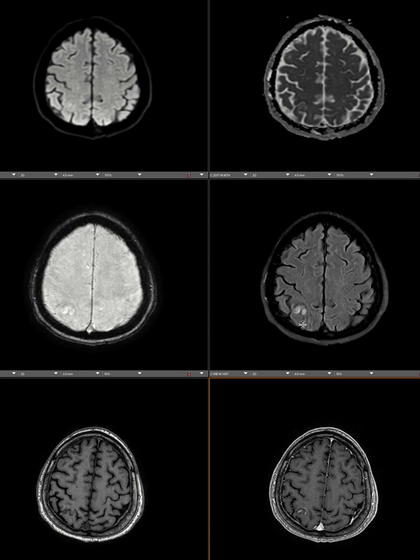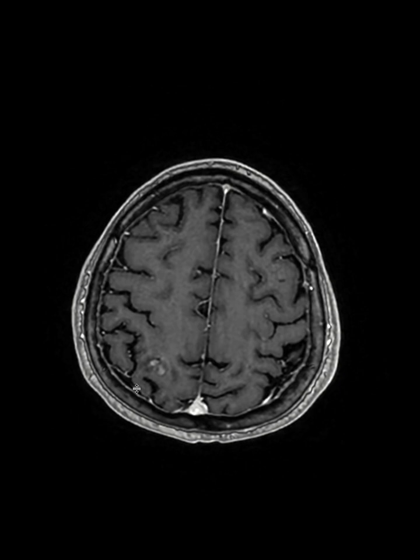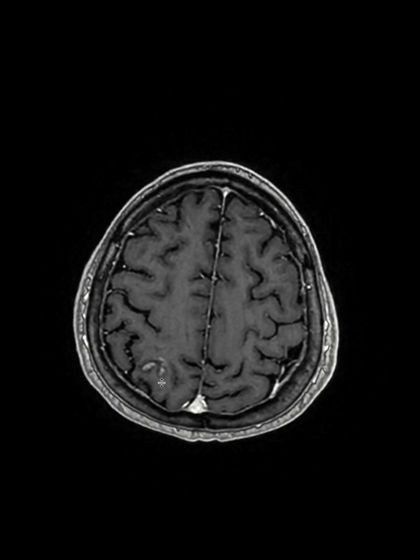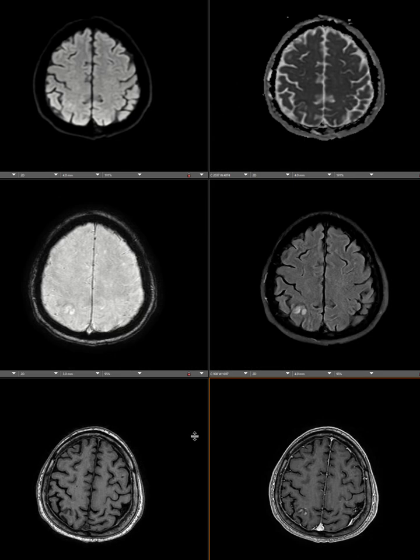So the hallmark of subacute infarct is the restricted diffusion goes away gradually. You're not going to see dark signal on ADC. You start seeing enhancement on the cortices in the region of involvement. So make sure you don't mistake this for other processes like a neoplastic process or something else. Actually, we have to know the history, but this gyriform enhancement in this patient that has a history of multiple sclerosis basically shows subacute infarct.